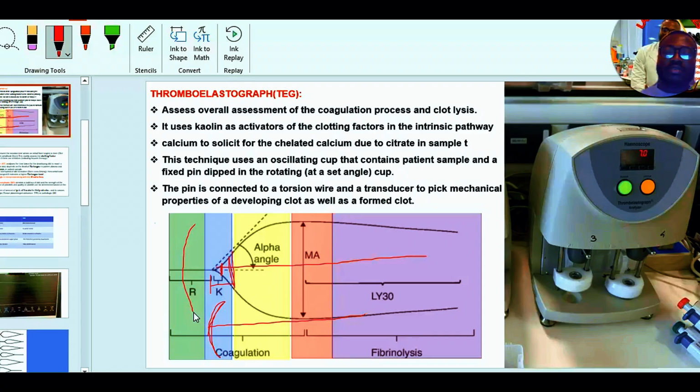If your fibrinogen level is less and it slowly traps platelets, it means that this angle is going to slowly enlarge. It means that when the clot began, the platelets began to be trapped gradually, and as it gradually goes on, the width or the size also widens, but it wasn't at speed. This is very simple. So if your fibrinogen level is really high and active and is able to trap platelets so quickly when there is an injury, in this in vitro setting, this angle will be wide. So this angle is going to be very wide here compared to what we have in the graph.